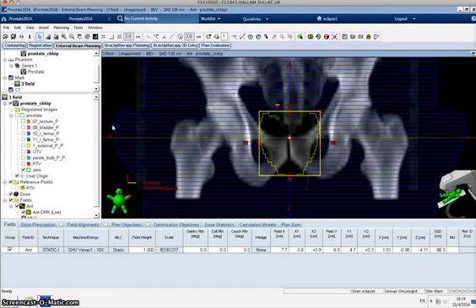In terms of moving the MLCs, if we wanted to move them, we can pick them up manually by selecting this one here, and then we can pick a leaf up and move it if we wanted to do that. So we will be doing that later on. And you can see that the jaws have moved in to back up the closest MLC to reduce the amount of interleaf leakage reaching the patient as much as possible. So that's our first beam on, that's optimized to the PTV, and we're now ready to create some more beams.